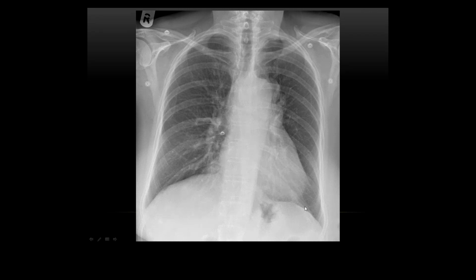So if we look here, normal heart silhouette, then you've got your ascending aorta, which comes up here, loops round, then that's your aortic knuckle, and then that comes down. So you've only got one aortic knuckle. What's this next to it? So you've got a sort of double aortic knuckle sign. Now, thinking of your silhouette sign, this isn't something that's directly next to the aortic knuckle, otherwise it'd blend in and you'd lose this silhouette here. So this is actually a posterior lung mass here.